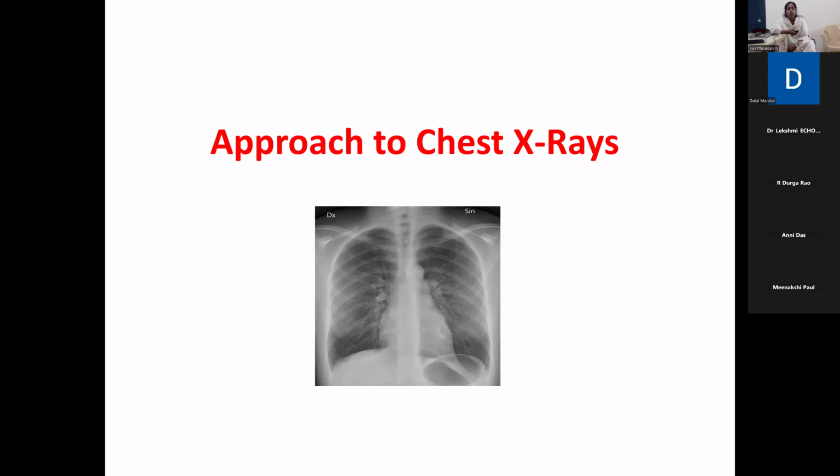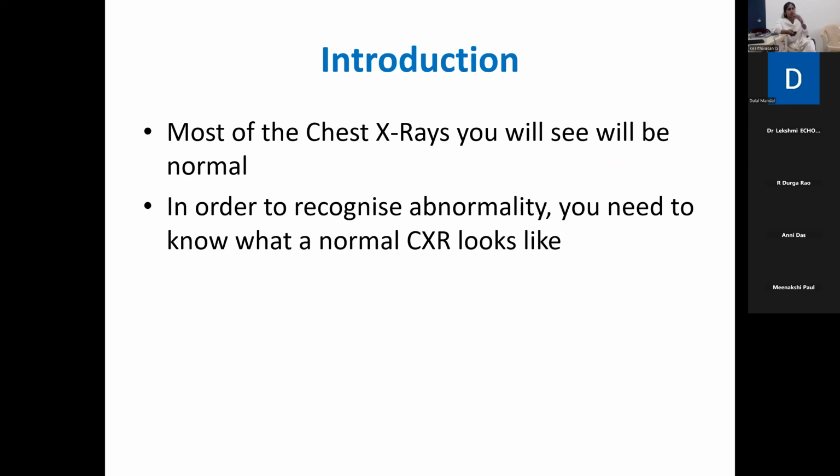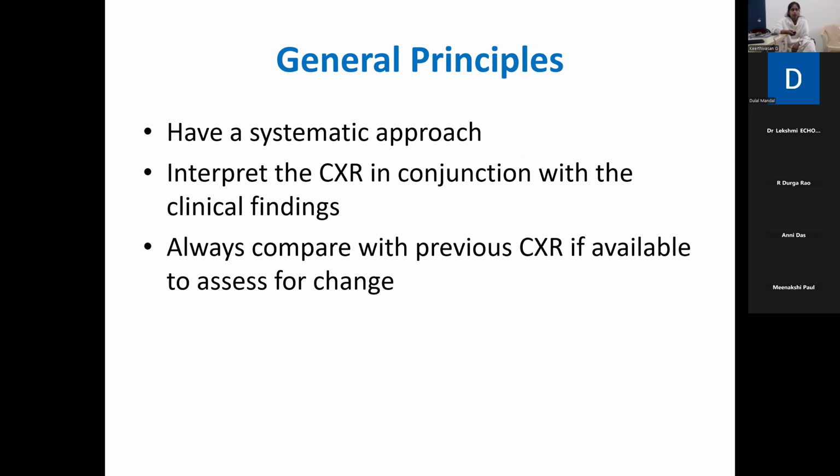Today, I'll help you to understand how to approach chest X-rays in your day-to-day practice, especially in diseases like tuberculosis. Most of the chest X-rays that we see in our daily OPDs or wards will be normal. But it is important that you know how to interpret a normal chest X-ray. Only then will you be able to recognize the abnormalities present in an X-ray. So we'll go first towards how to approach a normal chest X-ray.